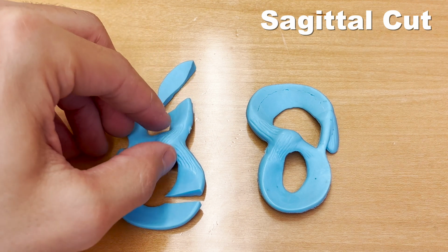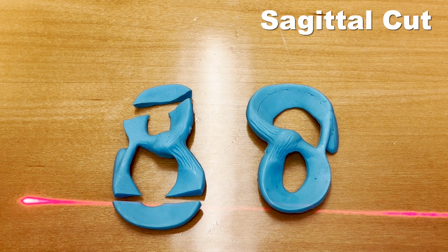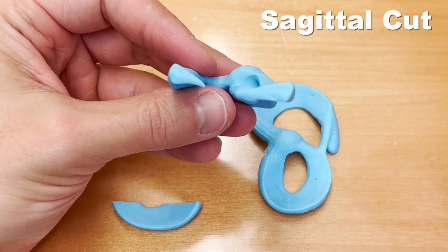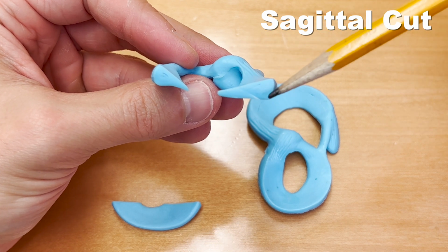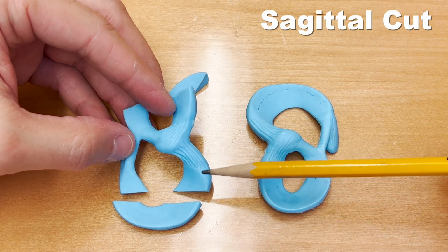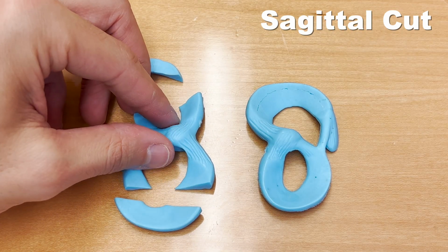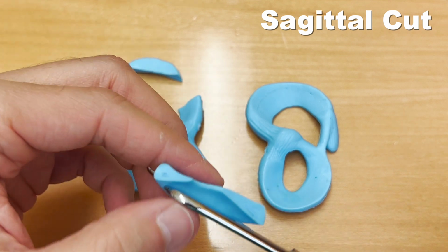As we continue to move across the meniscus, let's go down to this orientation. As we move across a little bit further into the middle part of the meniscus right here, if I flip that up, again we can see this similar triangular shaped cross-sectional structure just like this. That's what we would see on the MRI with a cut through that portion of the meniscus. As we start marching through, we can see how the meniscus shape would change. To help out with that again, I'm going to make a cut through this part of the meniscus just like so.